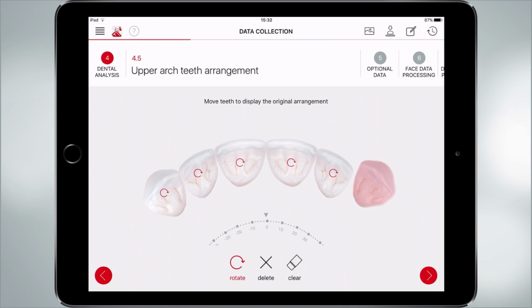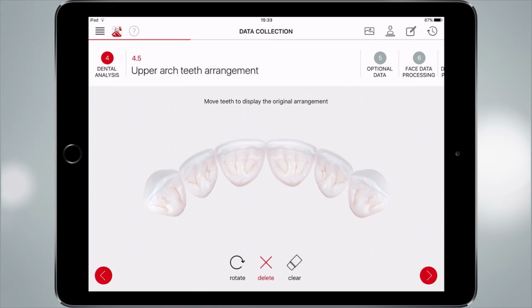Of course, this is very important also to communicate with the patient what will be your final outcome. Sometimes in the meantime we ask the patient, do you accept any kind of little rotation, for example, the lateral incisor? And maybe they say yes. But, for example, you do it this way. You try to move this more out. No, I don't like it. More in?